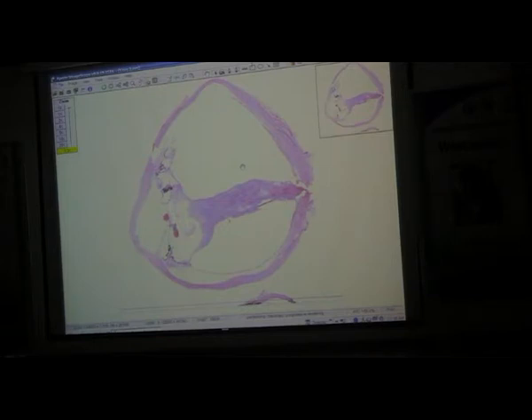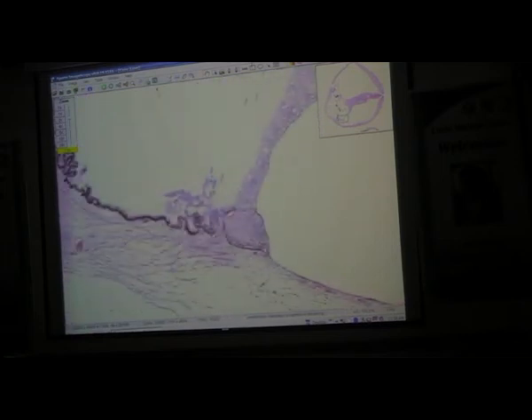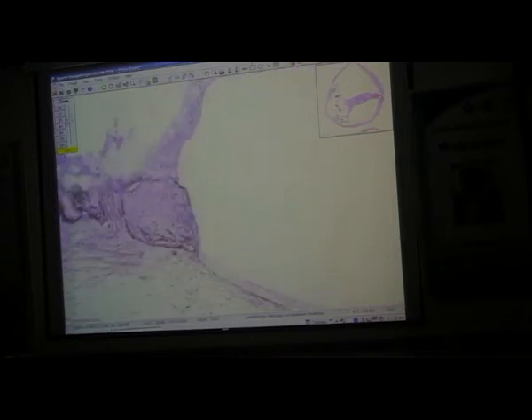I forgot to show you something about this case. A little curiosity. If you come out to the periphery of the retinal detachment, right out over here, I want to make sure I showed this to you before we left this case. You have a very interesting small finding. You can see the pars plana, you can see the retina, and where the retina terminates its detachment, you have an interesting lesion, a little nodule.